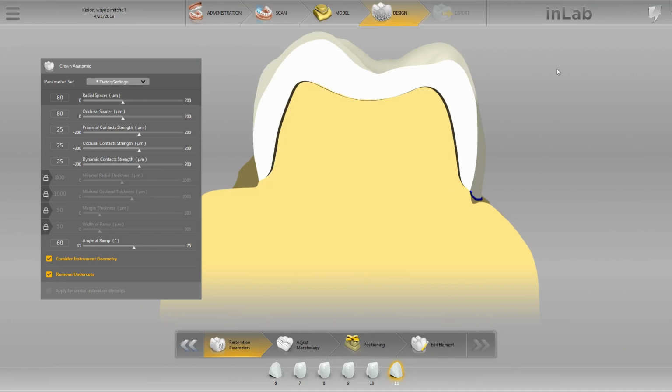I don't think we'll be able to put these teeth into proper occlusion without making these crowns stick way out. They would be way too protrusive if we decided to give this a normal occlusion. It just wouldn't work out in terms of functionality or aesthetics. So I'm thinking end-to-end bite, but we'll just see as we dive in what we end up doing as far as positioning the teeth and what kind of occlusion we end up with. So, with that being said, let's set our parameters.